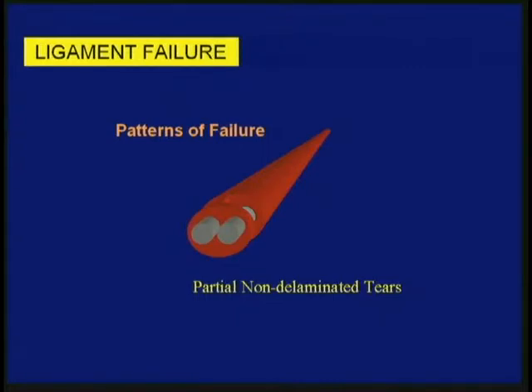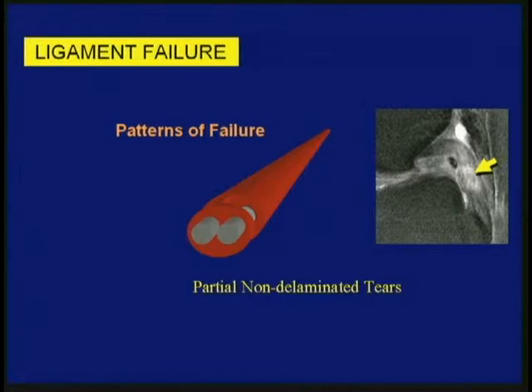The orthopedic surgeon comes around and will inspect this knee and do various stress testing, and depending on how many of the collagen bundles are interrupted, that knee will be judged stable or unstable. The example I show you is that of a posterior cruciate ligament tear that is not complete, but near complete, and is extending across as a transversely oriented defect.